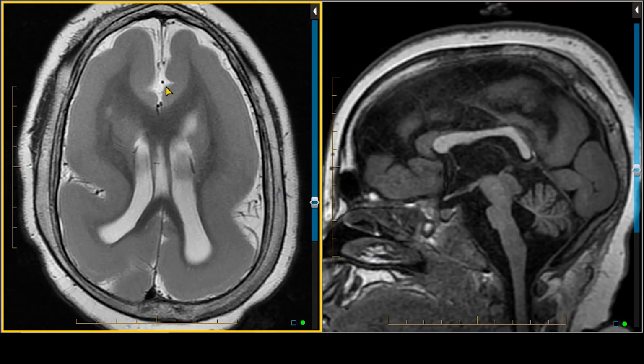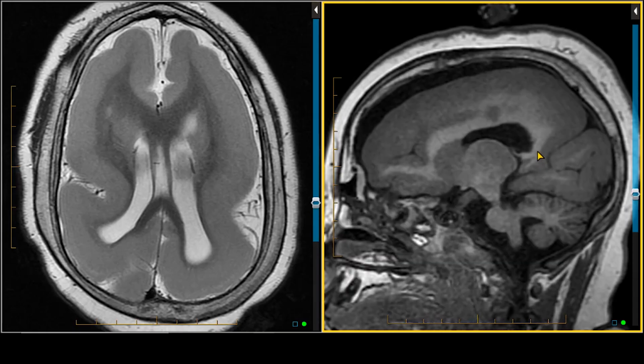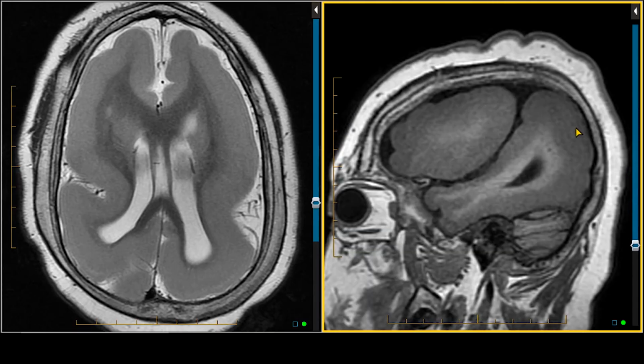We see, in this parasagittal aspect of the frontal lobes, the anterior aspect of the cingulate gyrus. If we go here to the sagittal image, we see the parieto-occipital fissure, we see the calcarine sulcus, but otherwise, we're seeing very few sulcations within the cuneus of the occipital lobe, as well as the lingual gyrus of the occipital lobe. If we go a little bit off to the side, we're also seeing minimal sulcation, very featureless brain.